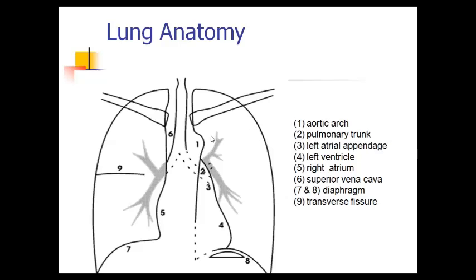Very important diagnostic points are the aortic arc, the shadow of the pulmonary trunk, the shadow of the contour of the left ventricle and right atrium, hila of lungs or shadows of great lung vessels and bronchi.